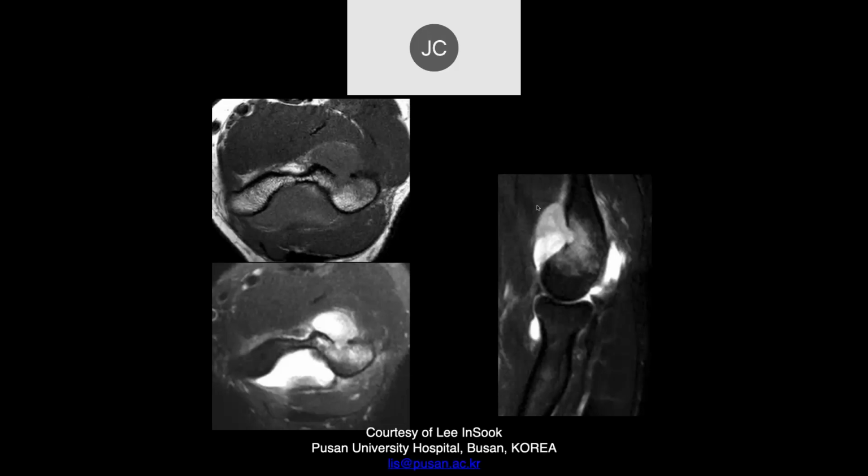I would say it's an erosive change. A lot of bone edema. Am I right, John? Right. And the cortex is definitely disrupted right there focally. Yeah, this also is TB. As you know, TB can basically look just about like everything. It can fool you in many different ways.